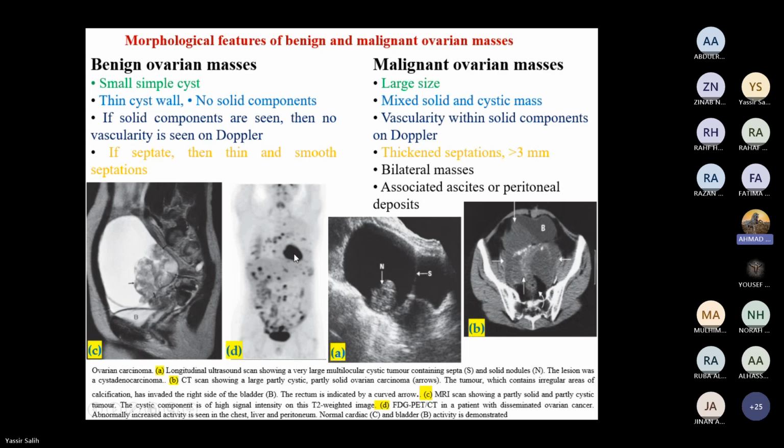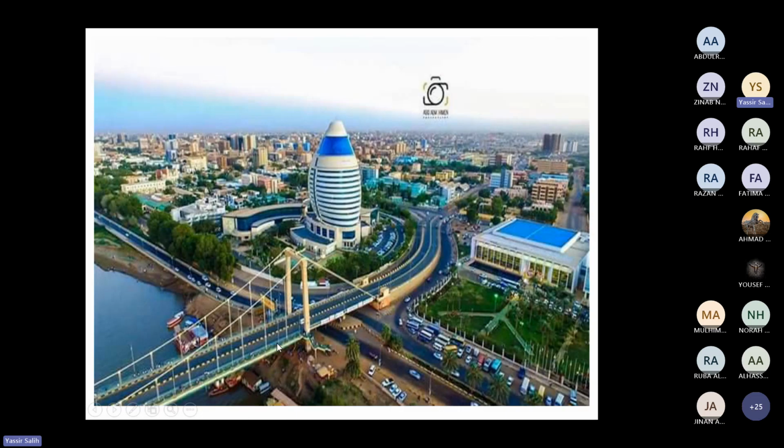But there are other lesions. Are these lesions normal or not? There is increased uptake in different areas, here and here, all of this is increased uptake. So this PET scan demonstrates what? This patient was a known case of ovarian cancer. What is your most likely diagnosis? Metastasis. This is a metastasis. So there is increased uptake in the chest and in the abdomen, but the uptake in the heart and the urinary bladder is normal.